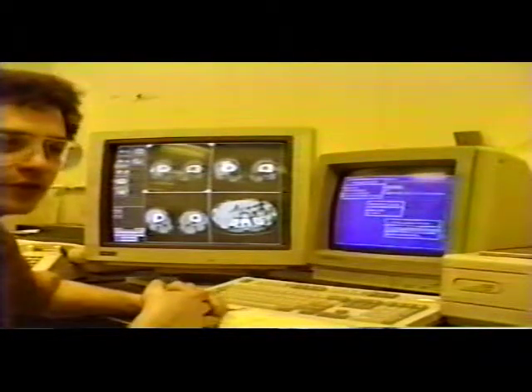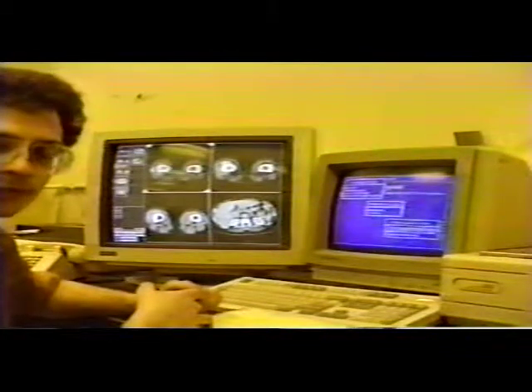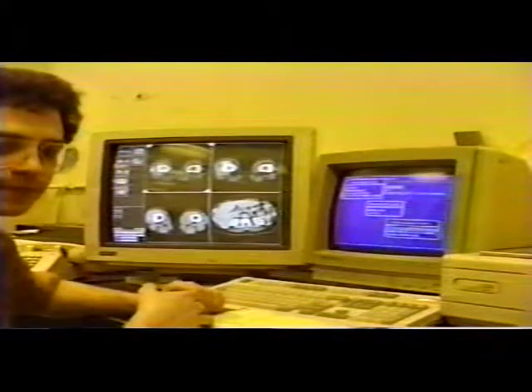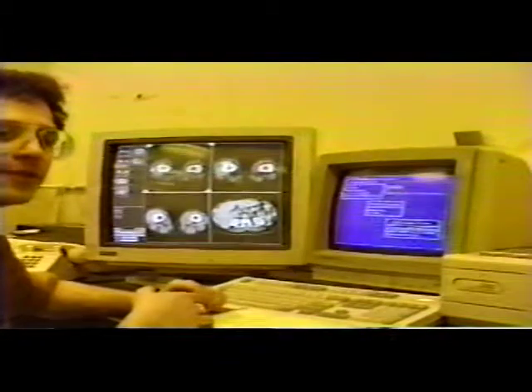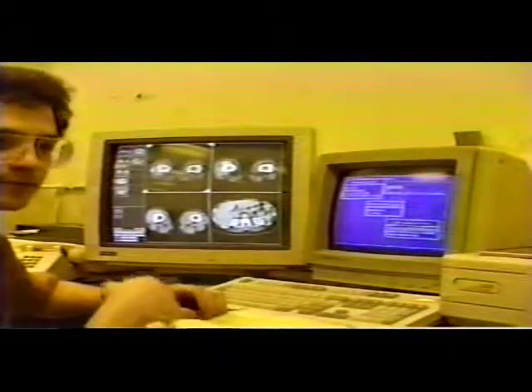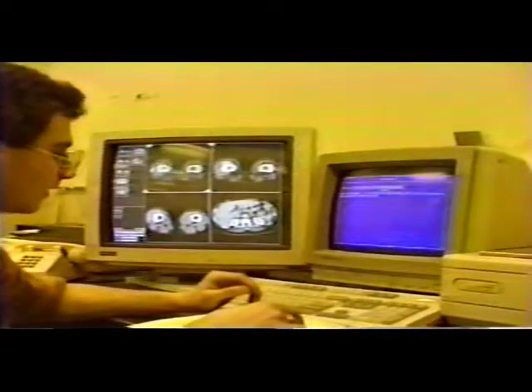It's interesting to note that during the early part of this development, from November, we were using an optical disk controller that was failing on 1 out of every 3 runs. We didn't notice this because the file system's redundancy was accounting for that. And we can abort that by pressing escape.